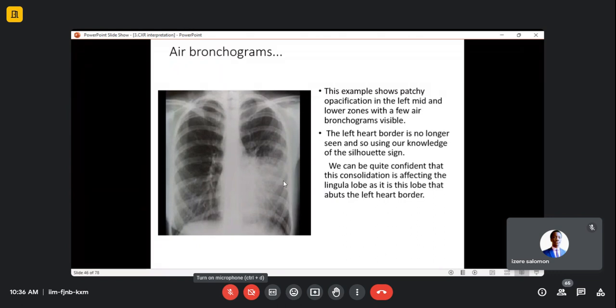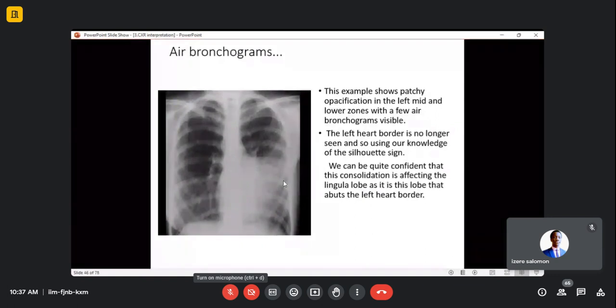If we add some clinical history of the patient, I can call it, according to the clinical history, pneumonia or lung contusion, or anything else if you try to relate to the clinical history of the patient. Okay.